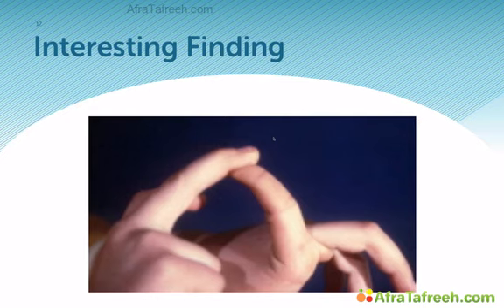Okay, in the meantime, I'll just answer a comment from Philippe, who thinks that we should also look at the aorta and check for aortic coarctation, which is completely true, because very often you will have a dilated aorta with coarctation. We did that. She did not have it. There's just one finding that would not be fitting perfectly to this combination, because then you would usually also have a bicuspid valve.